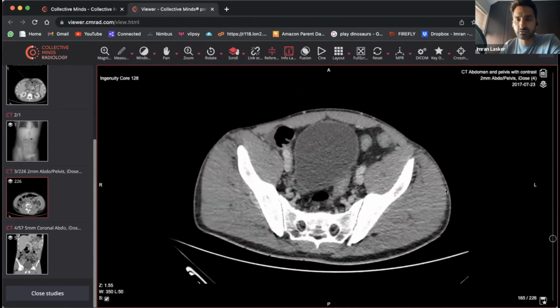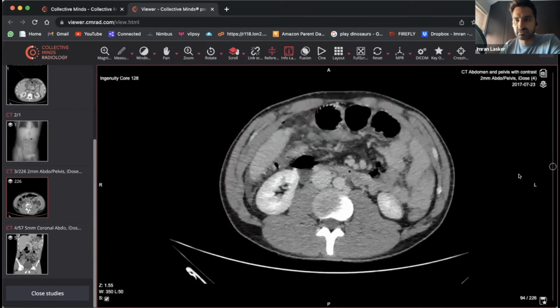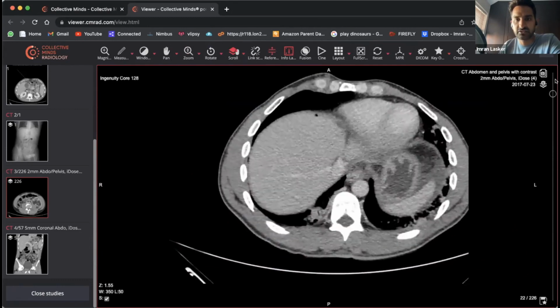a slightly older patient doesn't have big muscular glutes and abs and all this stuff. So the patient's quite young, clearly. They've got big paraspinal muscles, probably doing a lot of deadlifts and that kind of thing. It's quite a young patient.